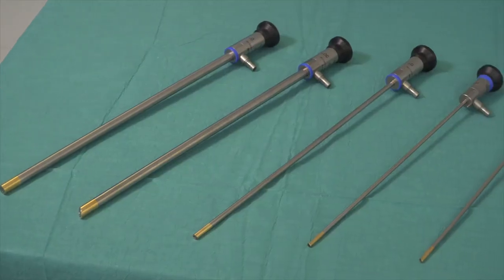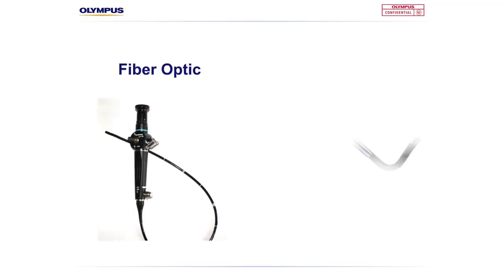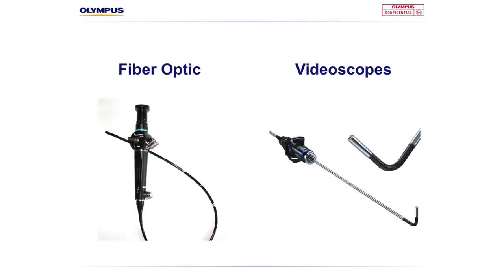The typical type of telescope used in laparoscopic surgery is a rod lens telescope, but there are also other types of scope used in the surgical realm, such as fibre optic and video scopes. Each has their own advantages and disadvantages. For more in-depth discussion on the different types of surgical scopes, please see the Olympus Imaging 3 Types of Scope video.